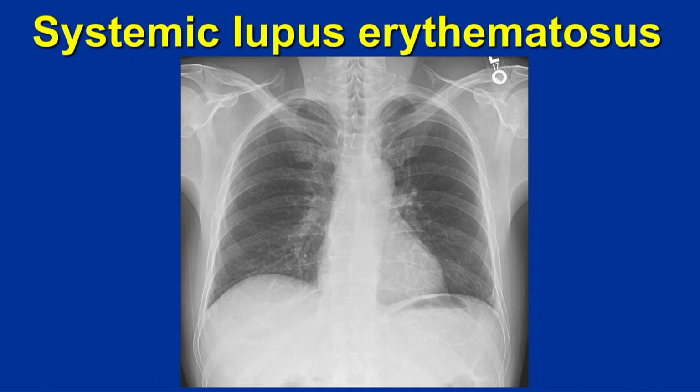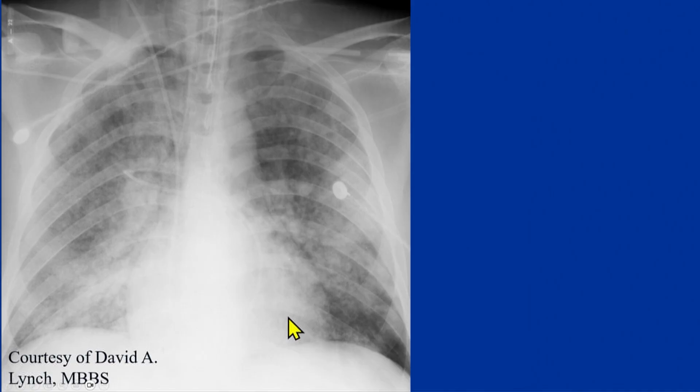And it turned out, at the time, I didn't know the patient had lupus. It turned out the patient had lupus, and so this is known as shrinking lung syndrome. So some of these patients with lupus, they develop profound diaphragmatic weakness, and so they can't get that diaphragm to flatten out. And so this is as good as we could get.